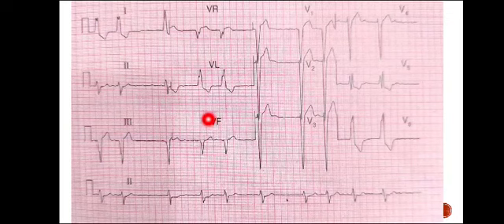Alright, the last ECG, look for the P wave. Again, you are unable to find any P wave in lead 2. Here also you can see in the rhythm leads that the rhythm is also irregular. So this is again atrial fibrillation. After that, you look at lead 1 and AVF. Lead 1 is upwards, AVF is downwards, so this is left axis deviation.